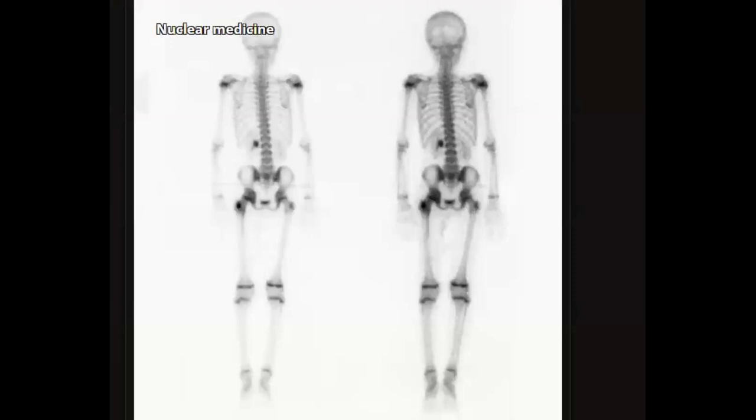So this young adult, this boy, comes to you and he has a pain in the left hip. What do you think? Where is the major abnormality? Do you think this is abnormal or normal? Yes, this is normal at such an age. So all this is normal in this age group. So where is the abnormality? This is the kidney. This is not abnormal even. So where is the abnormality here? Perfect. Excellent. Yes, so this is the abnormality.